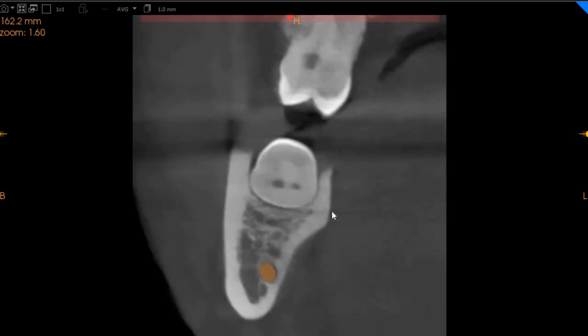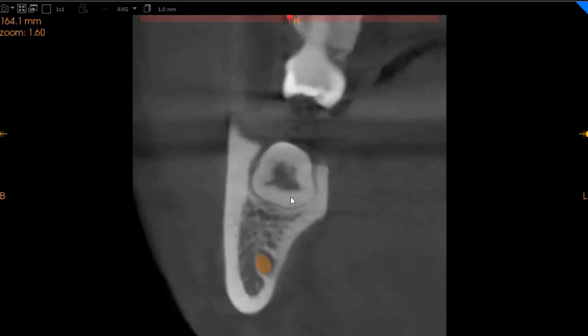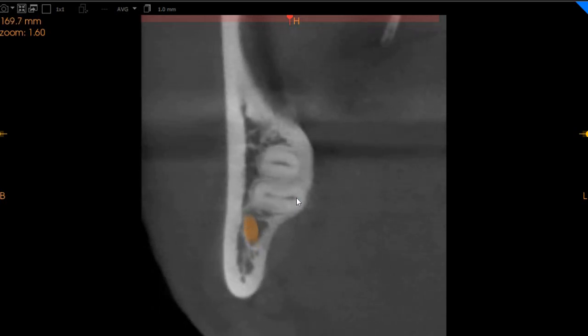On the lower left hand side, this is the wisdom tooth, again impacted in a horizontal fashion. As you can see, this is the mesial root, and here the inferior alveolar nerve actually comes relatively close in contact. Here the distance in this region is approximately 1 millimeter away from the inferior alveolar nerve. So as we are moving distally, you can see that the inferior alveolar nerve actually comes in contact with the lower left wisdom tooth right here.